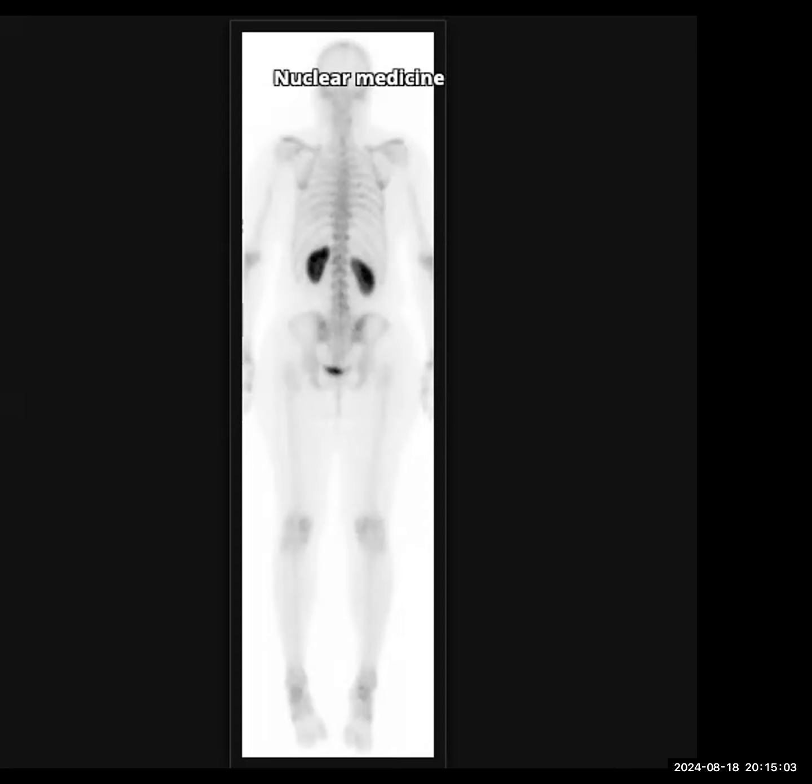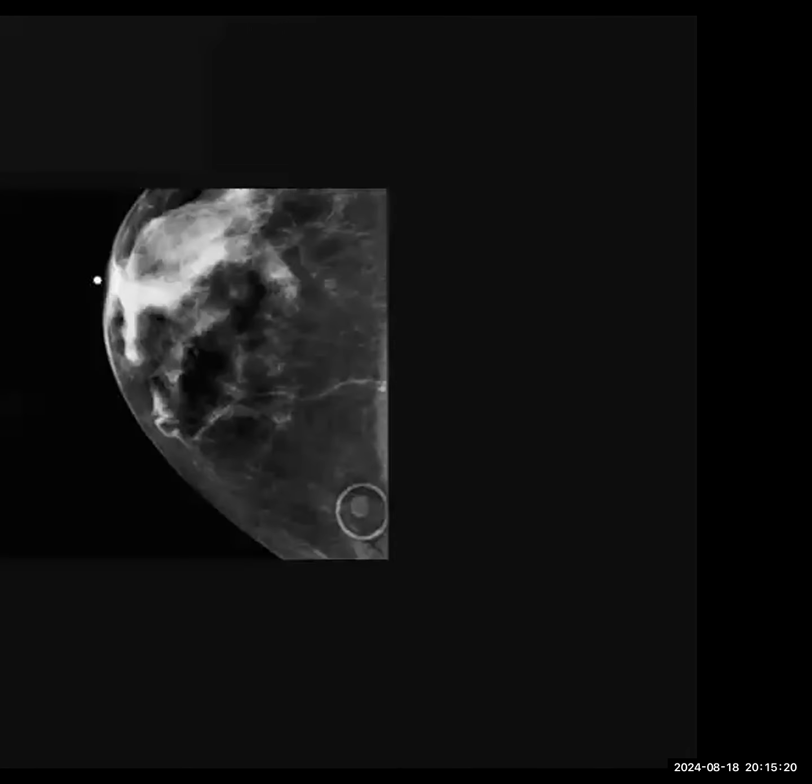So I'm not sure if this is a case of multiple myeloma. No problem. Is there anything else that you can add? No. Okay, no problem. Let's go to the next case.